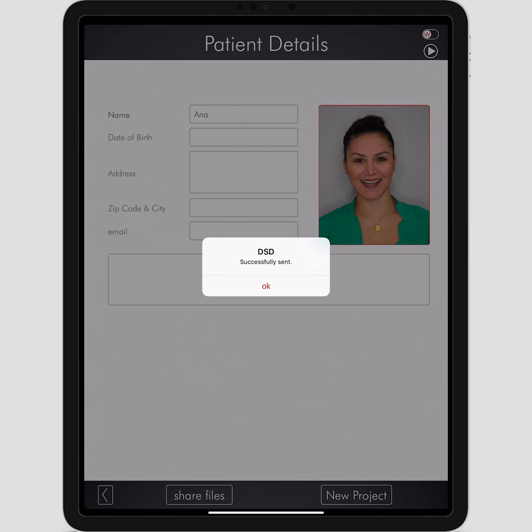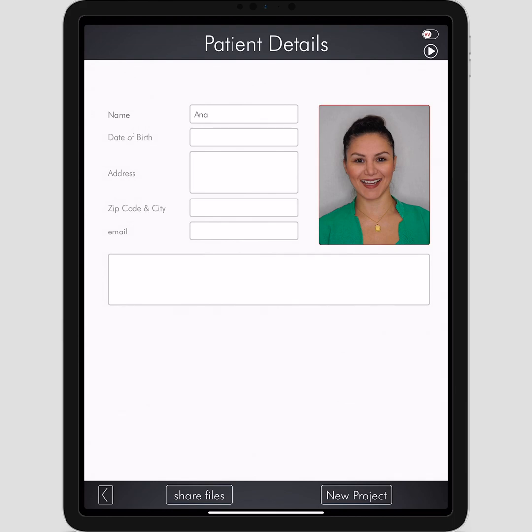And that's it. Since you're not a gold member yet, you're not able to save this case into your account. But you can export all of the patient's digitalization into one zip file, free of charge. Now let's go back.